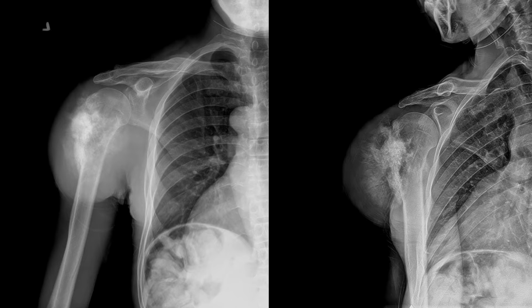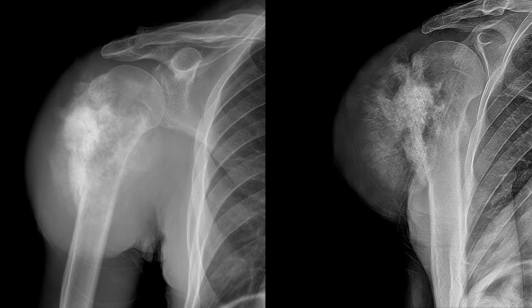The doctor correctly ordered x-rays on this patient to include frontal and a modified oblique view. And let's take a closer look at the area in question. There is a large, aggressive-looking osseous lesion at the proximal humeral metaphysis, and it's hard to see where this lesion starts and where it stops. Very ill-defined borders, a large periosteal reaction extending to the medial aspect of the humerus as well, probable cortical destruction, and then again a lot of soft tissue swelling surrounding this osseous lesion.